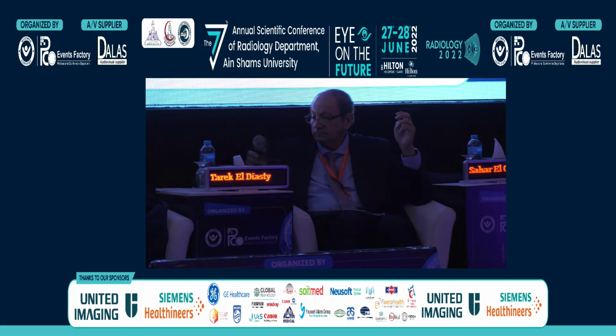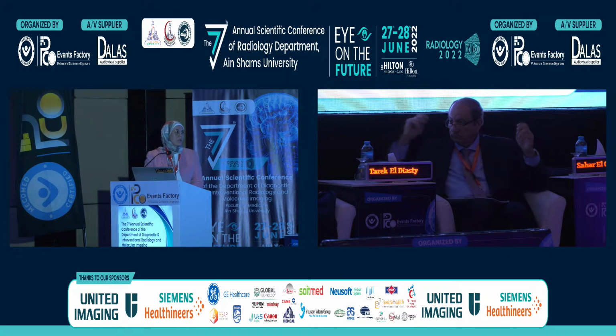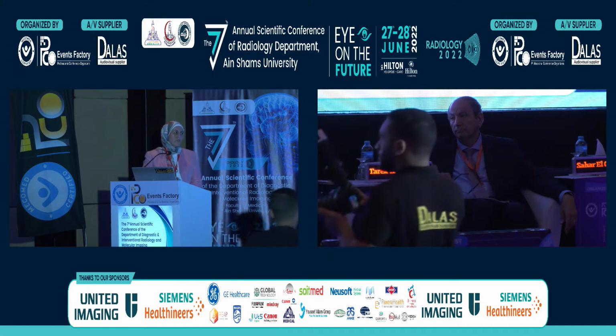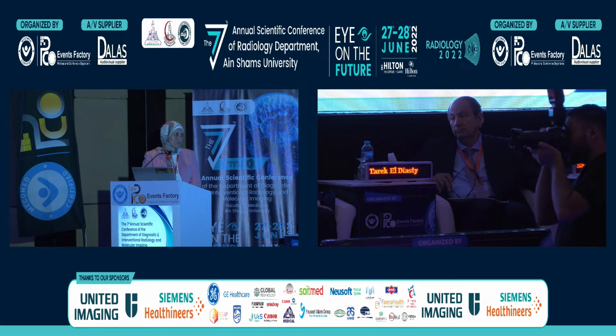Actually, we are still building our experience in the VI-RADS scoring. So we perform the whole imaging, including T2, diffusion, and the dynamic study. But sometimes the lesions are very classic on T2 and diffusion alone, and no need for contrast injection. But actually, because we can't follow every case during imaging and decide immediately which patient needs contrast and which patient doesn't, we do the whole multiparametric, including contrast injection.